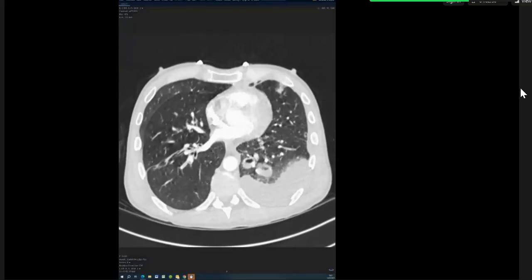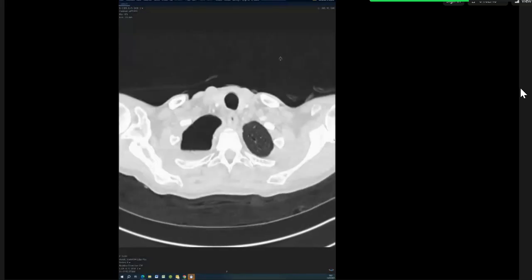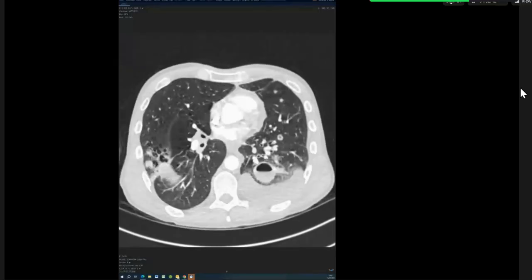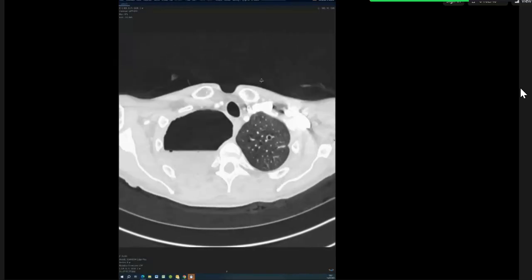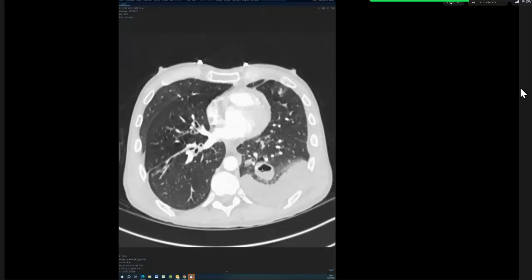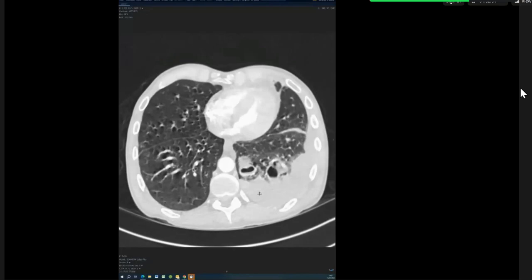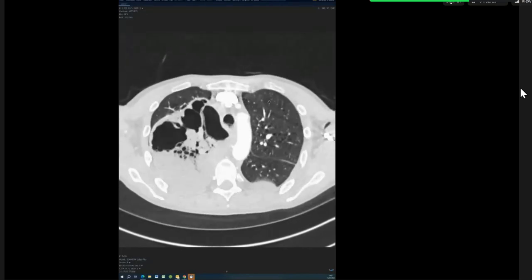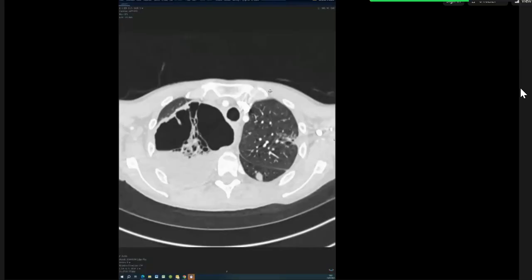Yes. So you picked the abnormality straight away, but I think your mind kept going back to TB for some reason again and again. If you don't see the tree in bud, then you need the scarring. The only way this can be TB is if this was old TB and the patient had dead space, and that got secondary infection. In the CT, I mentioned that TB is less likely.